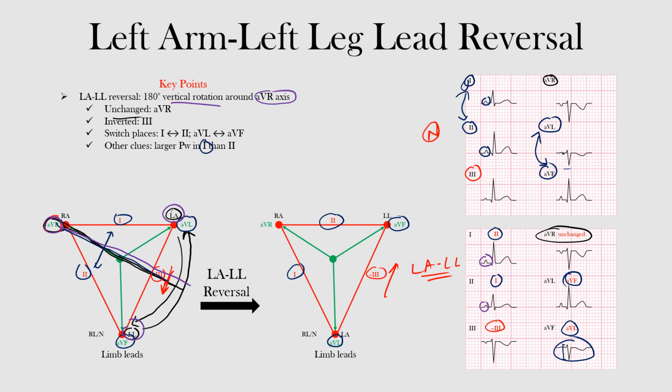Well, that's the end of this lecture. We discussed left arm, left leg lead reversal, and how to identify it on the EKG. I hope you learned something.